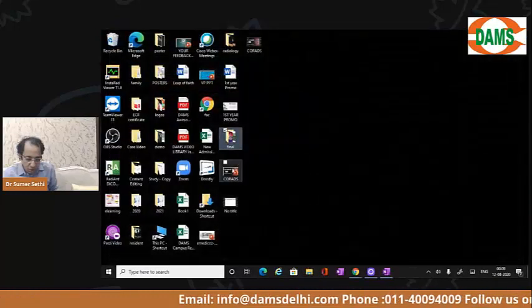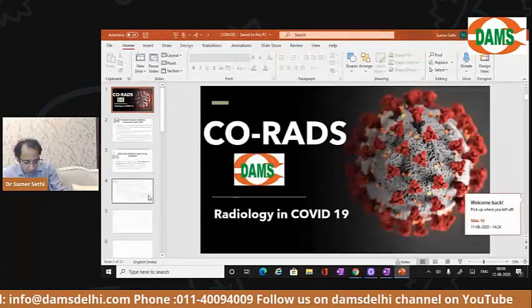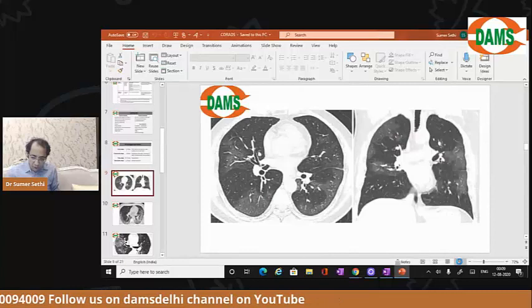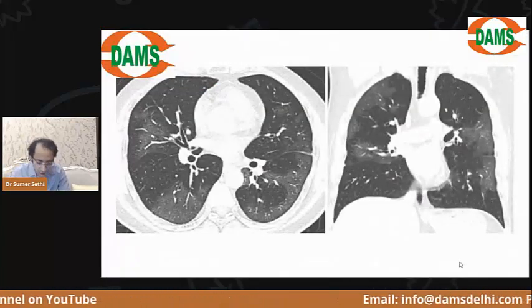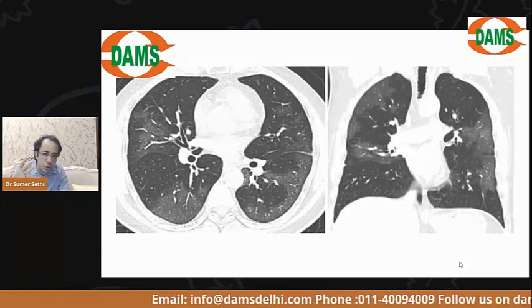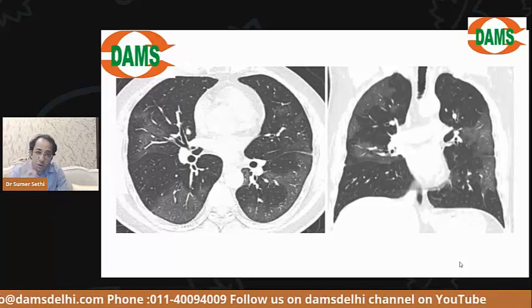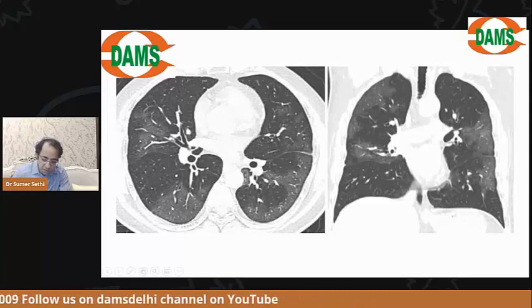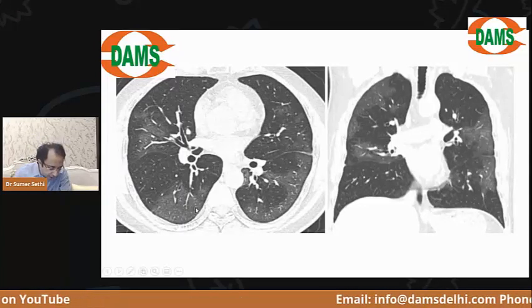Okay, this is one image that today only I had shown in one of the YouTube videos. You might have seen that video. So today we have seen that ground glass appearance is seen in interstitial lung disease like NSIP. It is also seen in pneumocystis pneumonia. But in current times, if you see ground glass, what do we mean by ground glass? मतलब सफेद है लेकिन उतना नहीं जितना न्यूमोनिया में होता है. It is hazy.